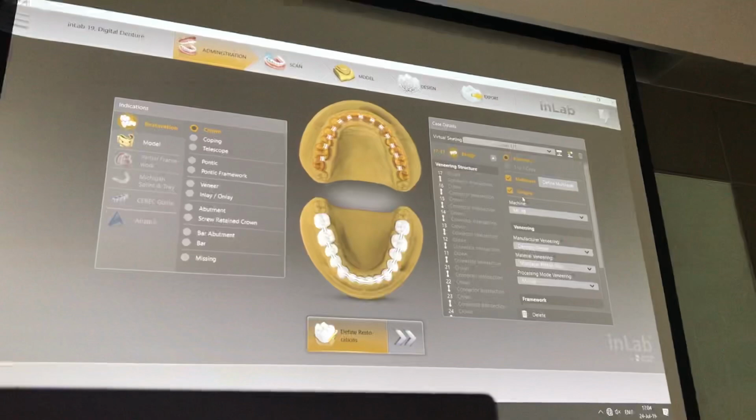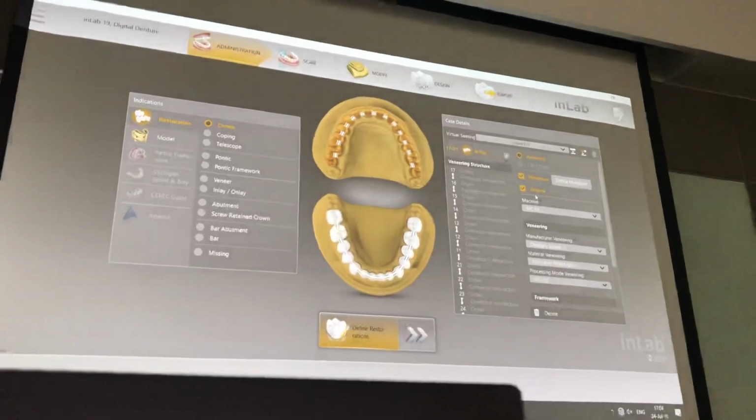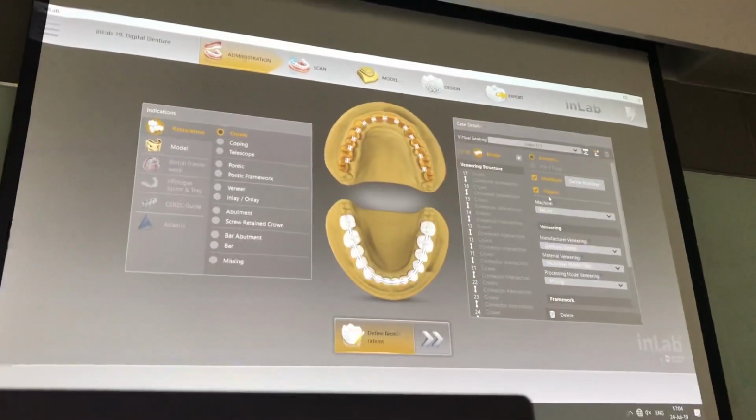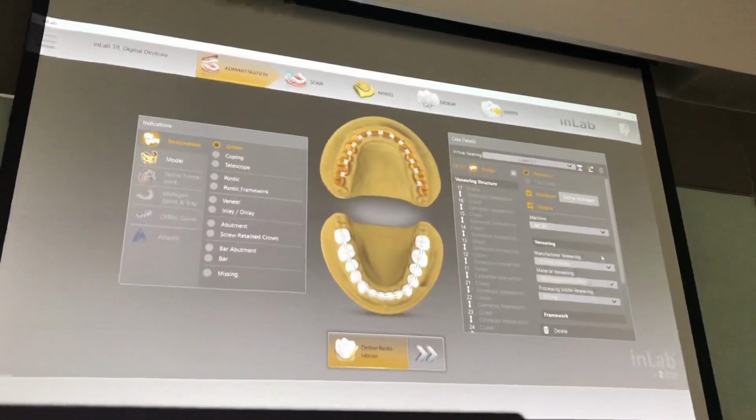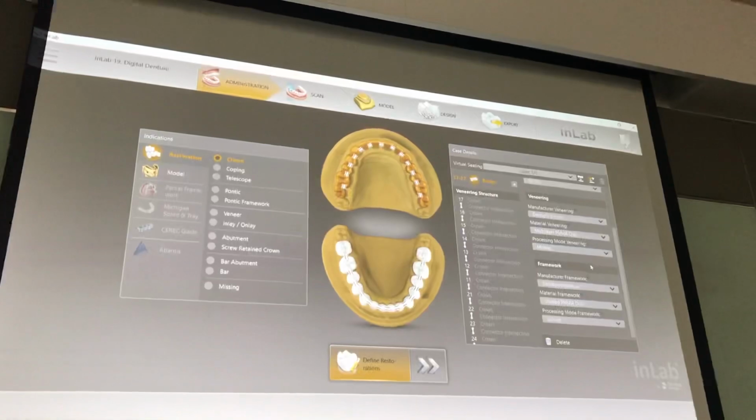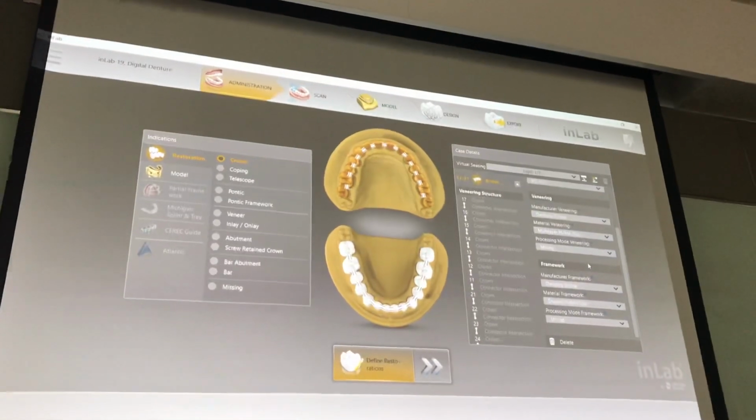So no crown, just Pontic, okay? Then you do multi-layer gingiva, 6 to 6 or 7 to 7, and you do top and bottom, same thing. And then when you do the veneering, because we're going to do everything with Inlab, right?